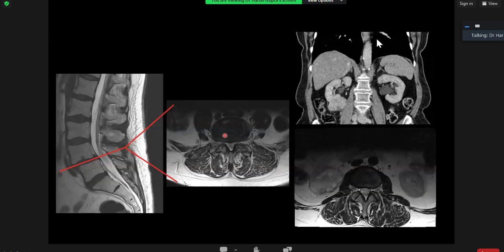Another thing is satisfaction of search. This patient comes with back pain and has degenerative spondylolisthesis. There is moderate central stenosis, lateral recess stenosis, and neural compression. But at the edge of the imaging, we see a renal abnormality, which doesn't look like a simple cyst. Get the patient back, there is a large renal neoplasm. I probably pick up a renal neoplasm once every 2 years or so. Not very uncommon.